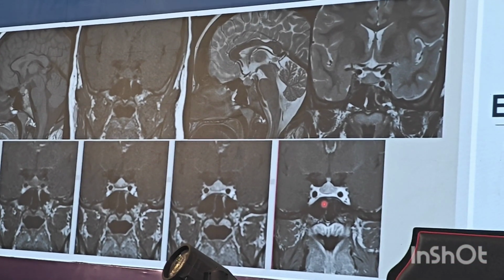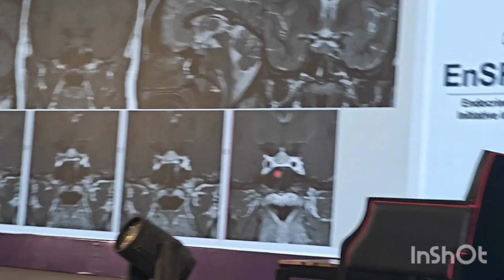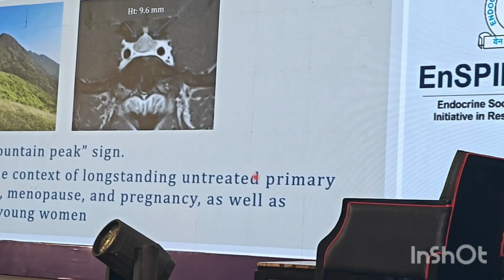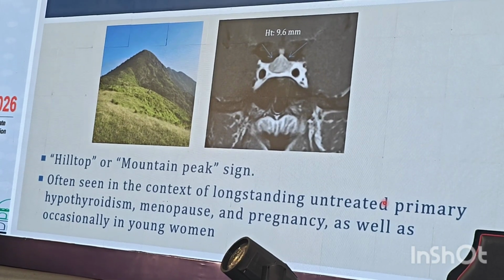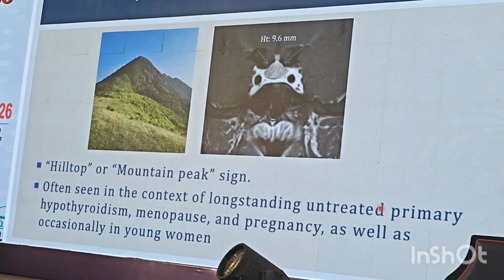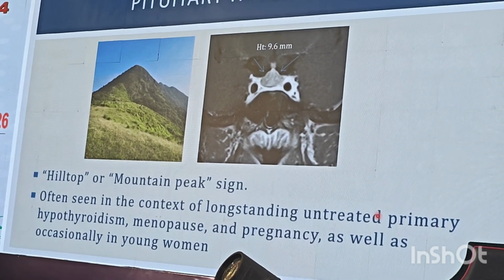So what do you think this is? Excellent. So this is a pituitary hyperplasia, and what you were looking at is called the hilltop or the mountain peak sign. So these are the causes for the pituitary hyperplasia.